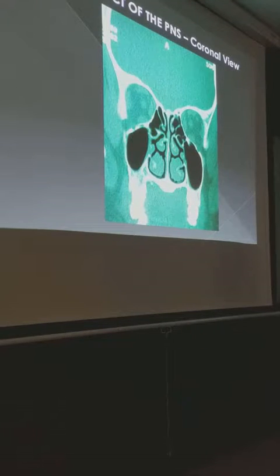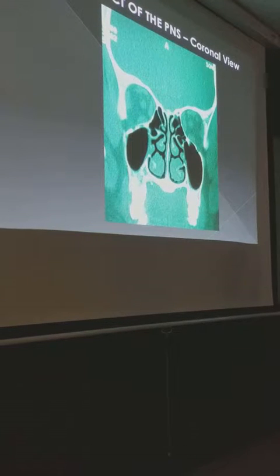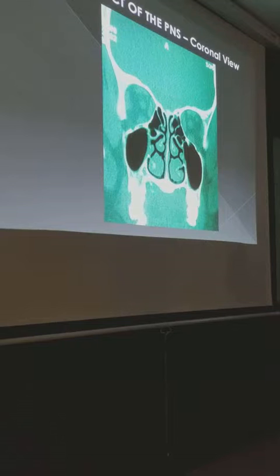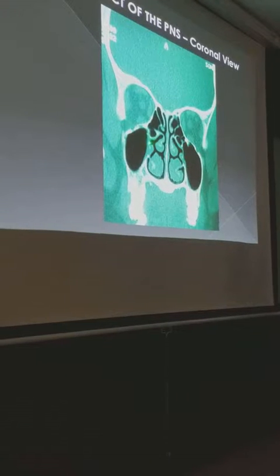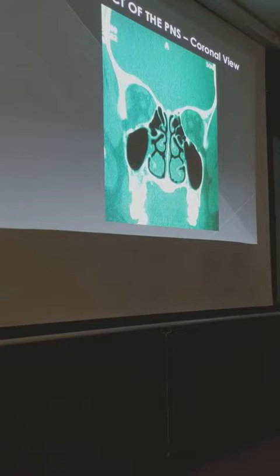Okay, posterior third. And where should this attach? If the first attaches to the lateral lamella directly across of the cribriform, the second attached to the lamina, where should this attach? Which is this one. Agree? Which is this one. You can't see it yet, but it is that one. And that, again, as I told you, is the posterior most area. The posterior most and the inferior most area of your uncinate process. Agree? So lamina, skull base is flat.